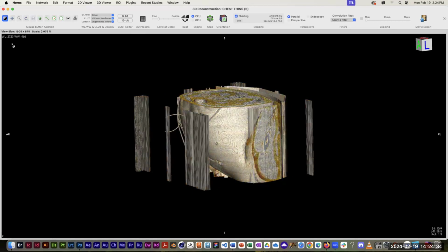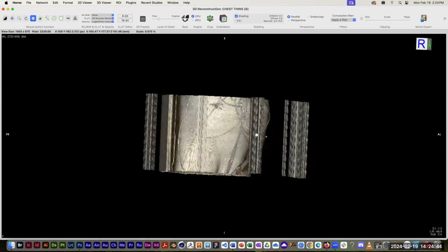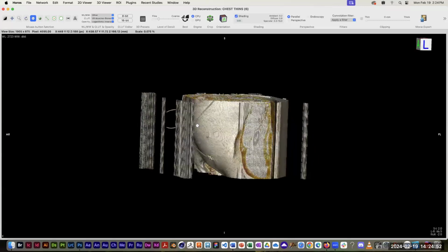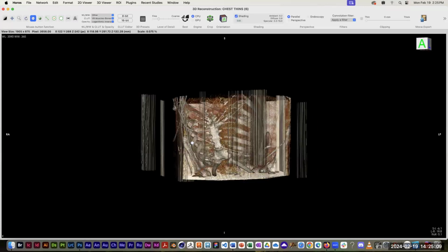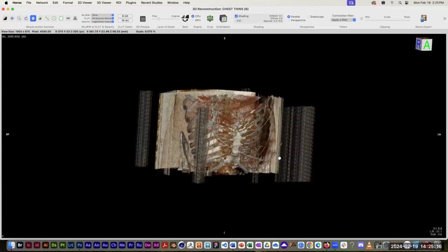Now, I just used our little grayscale tool, the window level tool, to make some of this guy visible and figure out what's going on with this guy. That's the thorax. I make some things transparent. You think he's upside down. Sure enough, he's upside down. So I've rotated the model a little bit, but I haven't flipped it. He came in upside down.